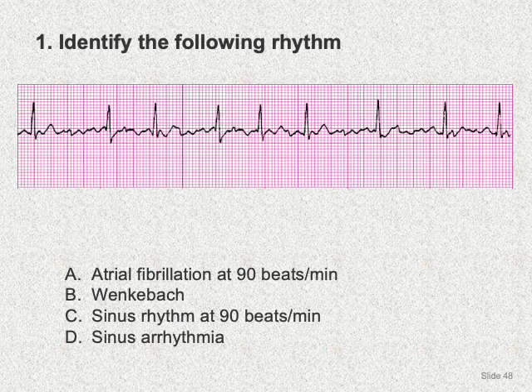Don't be misled by this coarse fibrillation. You might say that this is a P wave. No, this is not a P wave. As you see, it is coarse fibrillation. All are different. So this is atrial fibrillation.